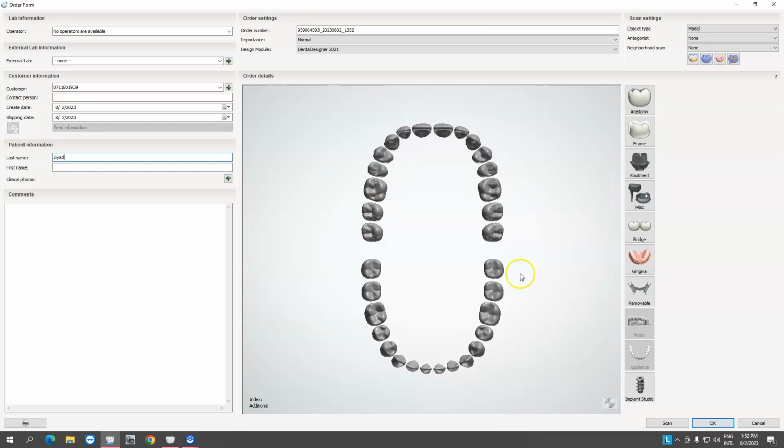on. You can select all of the teeth or just certain ones. For our purposes, I'm just going to show a couple teeth just so we get an idea of how this works. Now, it is important to realize that the teeth are labeled by the quadrant and then what number they are. So this would be number 11, 1, 1. And then moving on here would be 2, 1, 2, 3, 2, 4, 2, 5, 2, 6, 2, 7. That's just important to keep in mind that it is not using the universal naming, and it is just using the quadrant along with what tooth number.